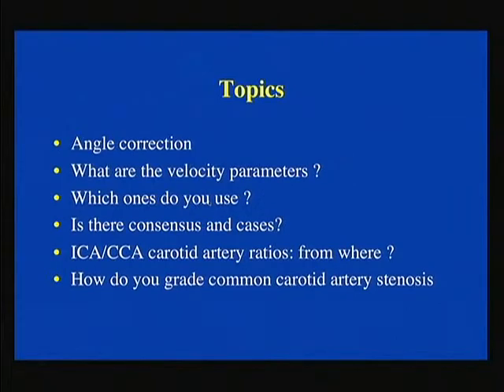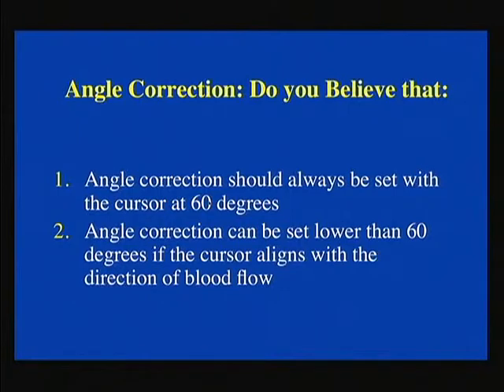Talk a little bit about ratios, ICA to CCA ratios, and something about the common carotid artery. We always forget about the common carotid artery. It's so lonely, it needs more attention. So we'll talk about common carotid artery grading of disease. This is two questions.